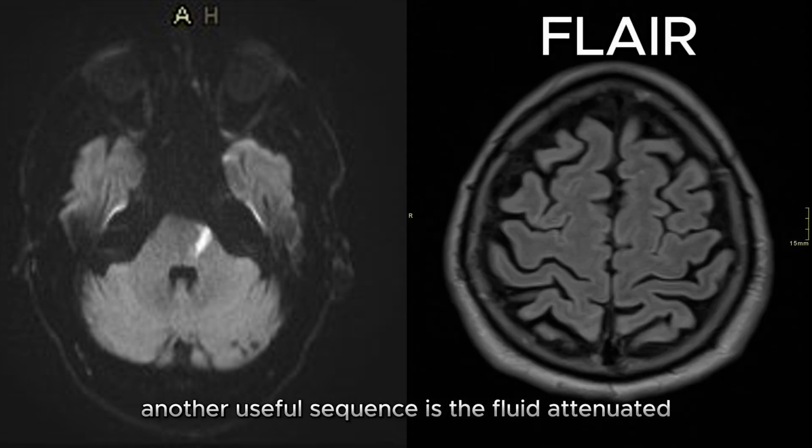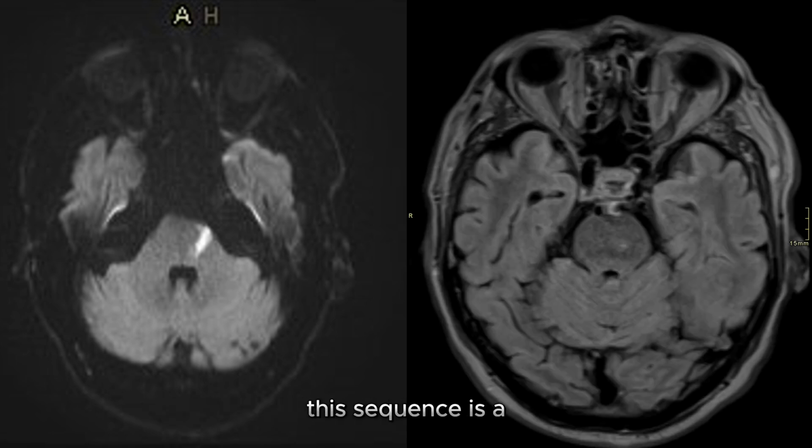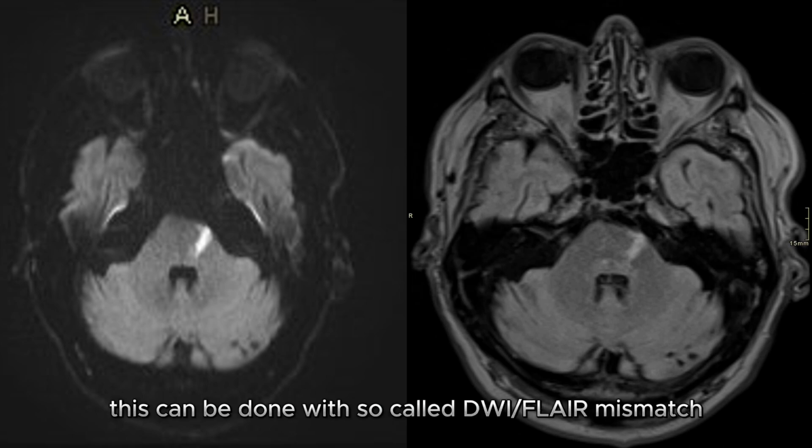Another useful sequence is the fluid-attenuated inversion recovery, or FLAIR. This sequence is a T2-based sequence with a long inversion time. This sequence is useful for many reasons, but one important use for acute ischemic stroke is to help estimate the time of onset, for example in wake-up strokes. This can be done with the so-called DWI-FLAIR mismatch.